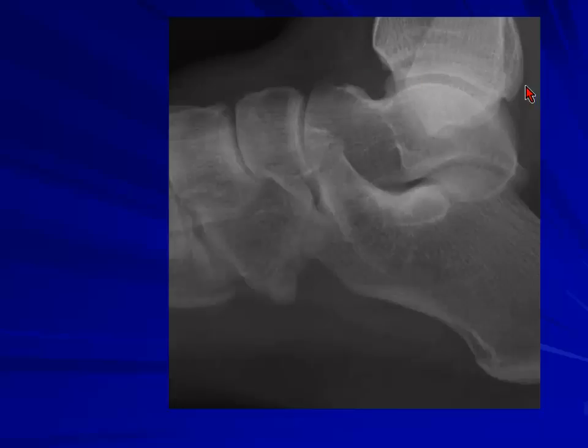You look at this, you see the space, you say it's fine. Then you come into the subtalar joint, and if you see the space, you're fine. Then you look at the talonavicular joint, you see the space is fine. But here, because of the way it's being projected, you can't see the coalition.